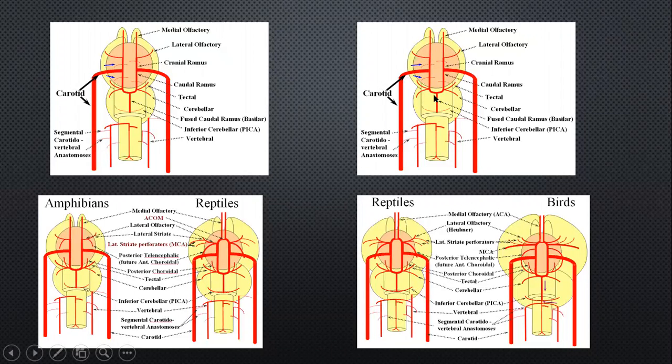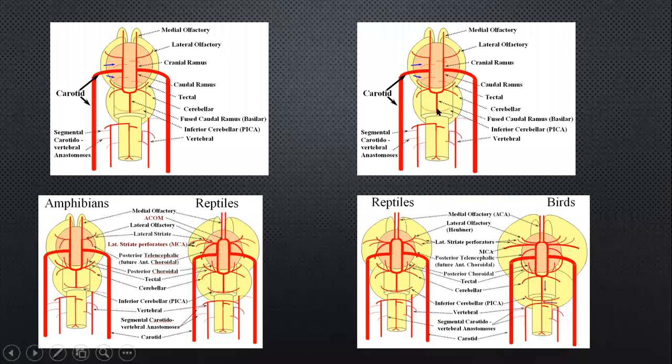And understand again the fact that the posterior communicating artery, which is developing as a caudal branch of the internal carotid artery, is still not joined up with the vertebrobasilar system. And here we are still in the birds, where you can see the direction of the flow in the posterior communicating artery in the upper basilar is in that direction.